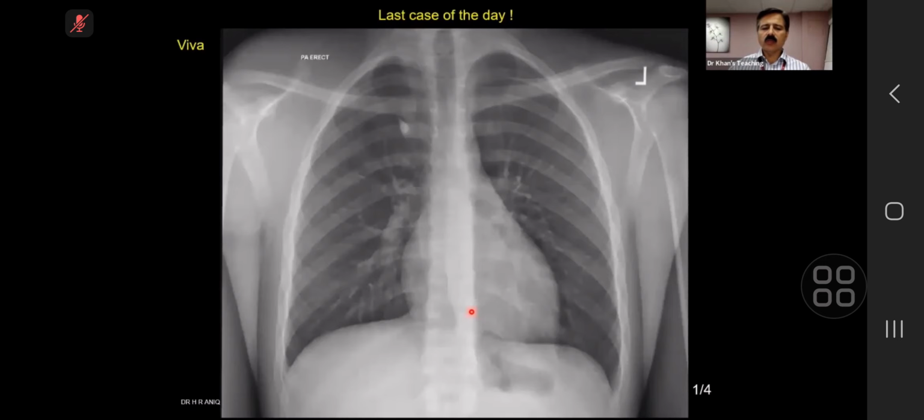That's the key. So for example, it's the bony thorax. You start saying, I'm looking at the ribs, I'm comparing the right first rib with the left first rib, it's normal. I'm looking at the right-sided other ribs, the second rib is normal, the third is normal. Go into these details and you will pick up the finding. But don't panic. Keep talking and that will help you.